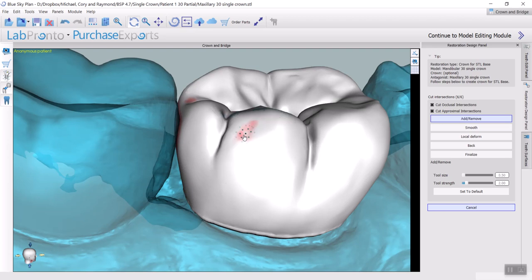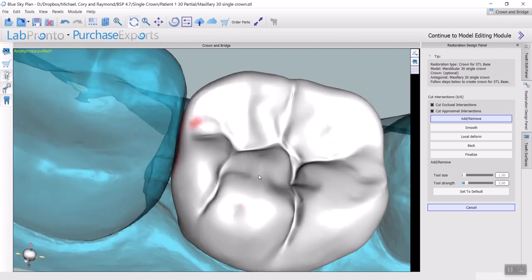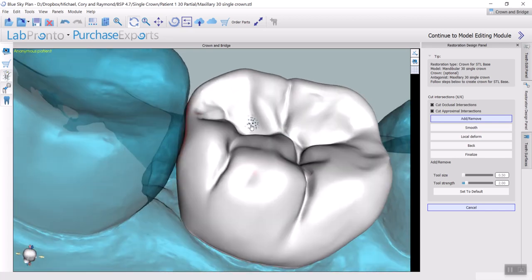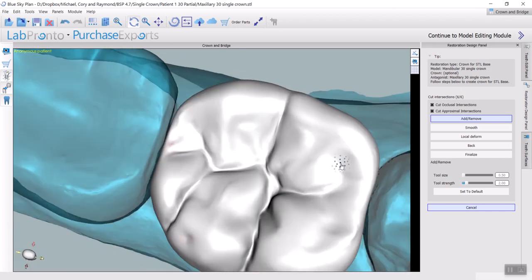This is something that I learned from Cerec. I just do single clicks and actually they look really natural when they're used properly because they resemble all these fracture sides, right? So now I will just accentuate the anatomy a little bit. I really do this with my burs at the end, but I just want to show you the functionality of doing this. I can accentuate the anatomy.